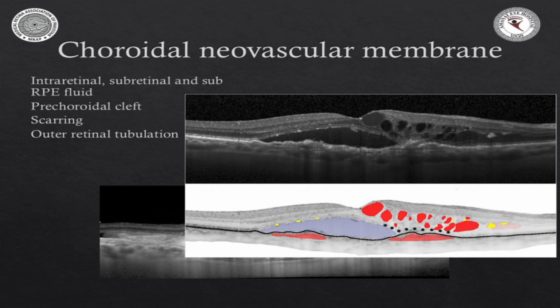It's a filled-in appearance of the foveolar contour, its concavity. It appears filled in, but what differentiates this from an epiretinal membrane is that there's no surface wrinkling. And instead of the foveal contour getting obliterated as you would see in vitreomacular tractions or epiretinal membranes, the foveal contour stays the same, and the overlying central hyaloid, the posterior hyaloid membrane, appears to fill into the concavity, sort of like a kid has just colored in your foveal contour.